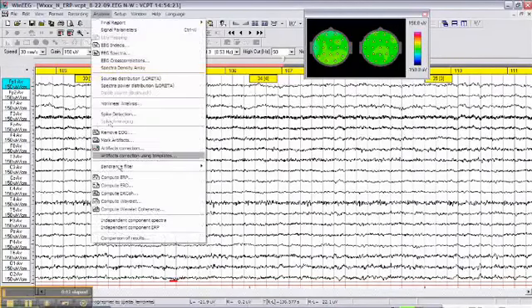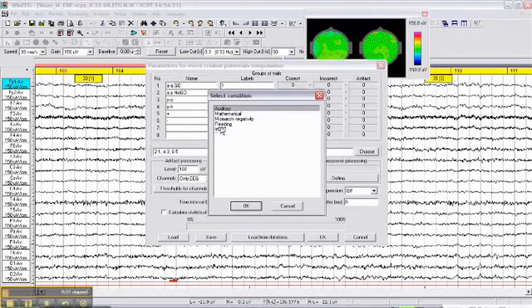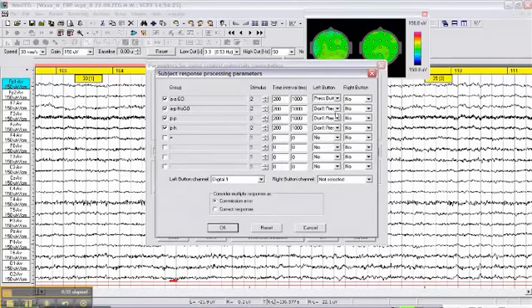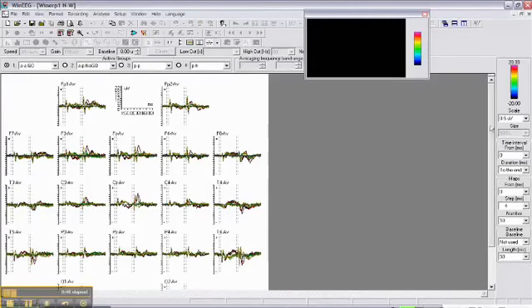So go to analysis, click compute ERP option, download parameters of processing from the database, click VCPT, we are doing VCPT task, and check whether the parameters were already defined for subject response processing, and they were defined, digital 1. So click OK, and the program computes ERPs.